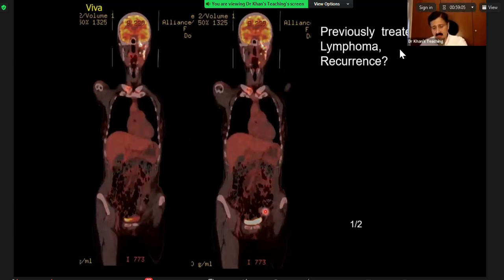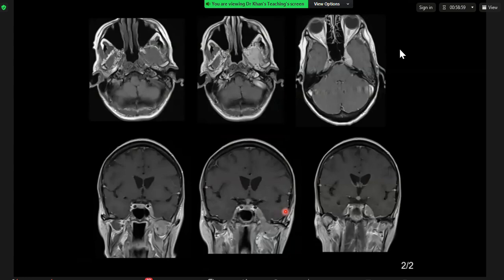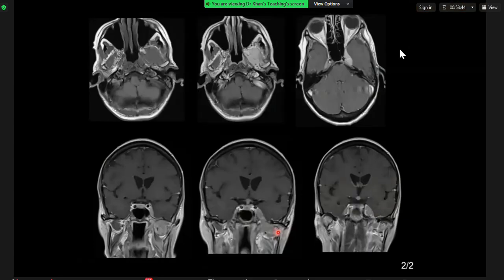Okay, I have given you an MR, which I believe is better. Sure. So this is a series of images of MR brain, which I will focus at the regional interest in the left. Okay, just concentrate on this one and maybe this one. Okay. This is post-contrast.